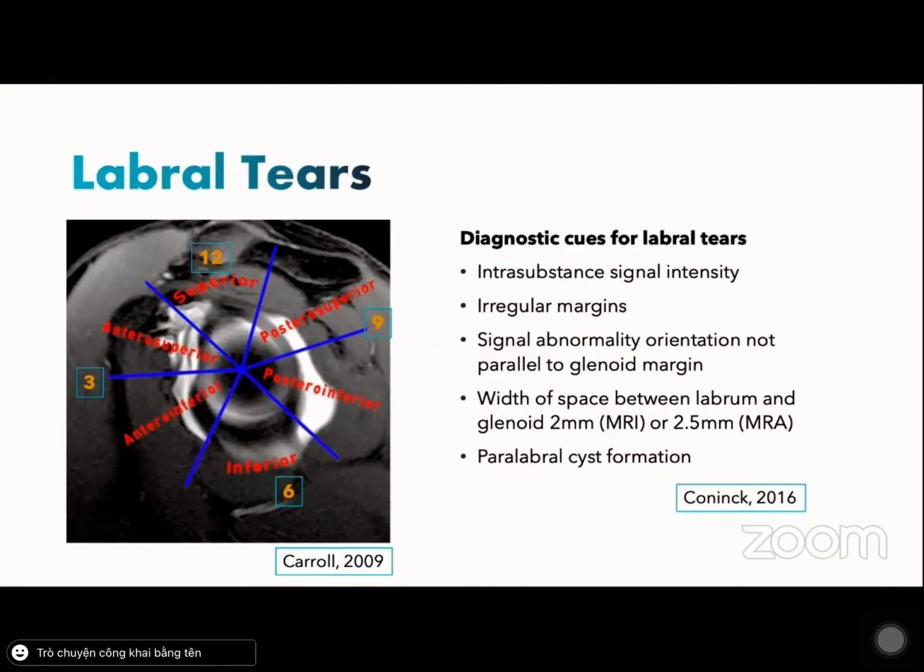But before we get into the specific labral tear patterns, we should set some ground rules on how we describe labral tears on MRI. First, describing a location. The image on the left, a sagittal en face view of the glenoid, demonstrates the two common methods. First, a clockwise approach, where 12 o'clock is the most superior point, the insertion of the biceps long head, 3 is anterior, 9 is posterior, and 6 o'clock is inferior. This applies to both left and right shoulders. We can also use the 6 zones: anterior superior, superior, posterior superior, posterior inferior, inferior, anterior inferior. Both methods work equally well.